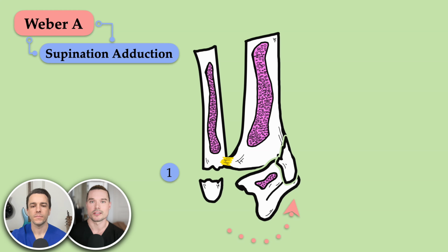The syndesmosis is highlighted in yellow. So appreciate how the fracture line is below that. Anterior syndesmosis is attached. We could also have disruption of our lateral collateral ligament, which would attach that distal fibula and that talus. And there's just some soft tissue swelling in that area and a gap. Our stage 2 Lauge-Hansen is that adduction force, which drives the talus up into the medial malleolus, and it creates that oblique-like fracture.